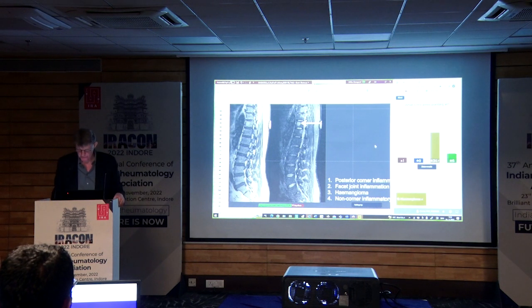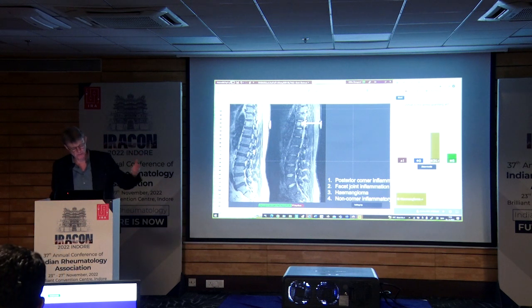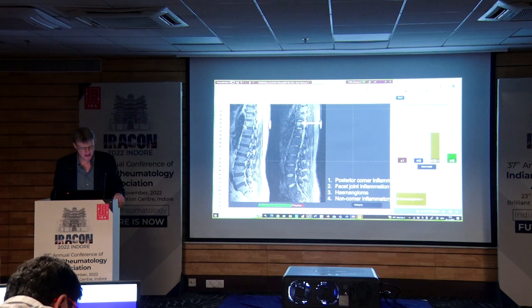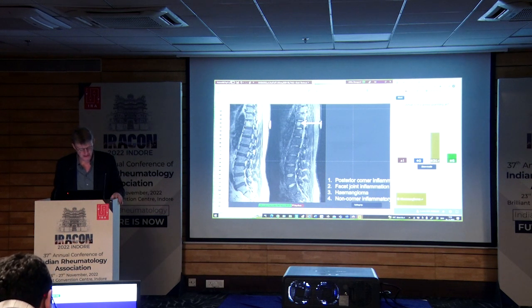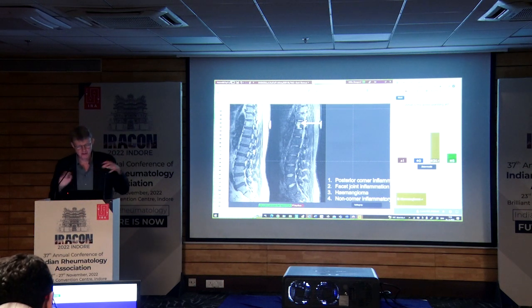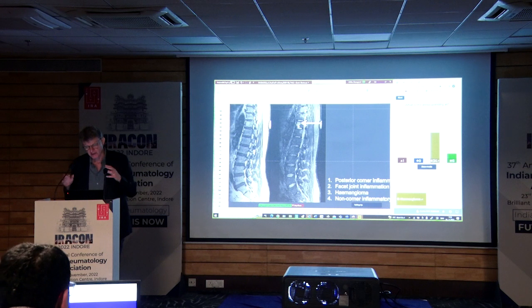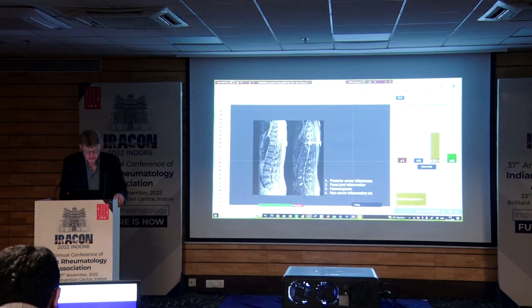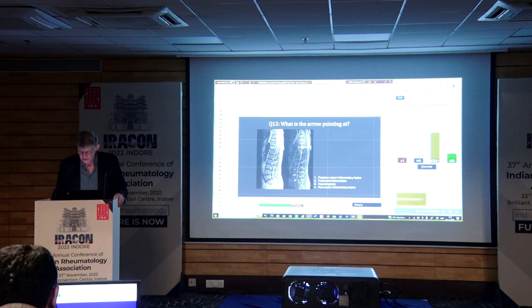Yes, that's also completely correct. You have in hemangioma a rounded structure with generally both more fluid due to the vascularity and also fat around the vascular area, so that it's slightly bright both on STIR and on T1 as typically, and away from the corners, and it's not related to inflammation or anything. So it's just a coincidental finding. Quite frequent.